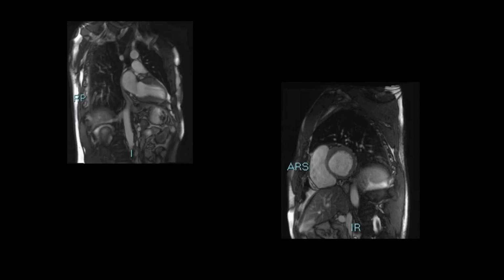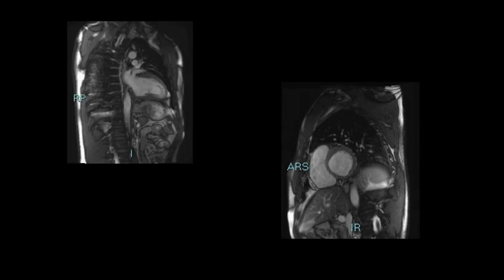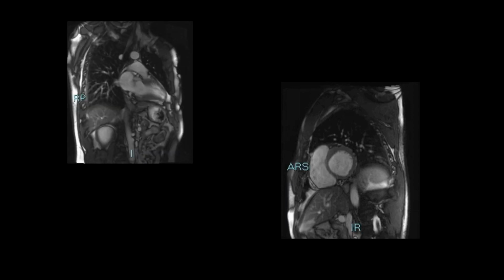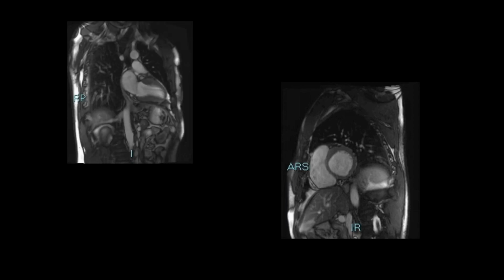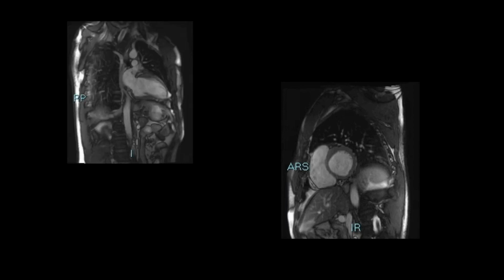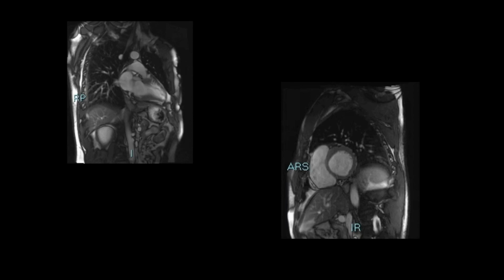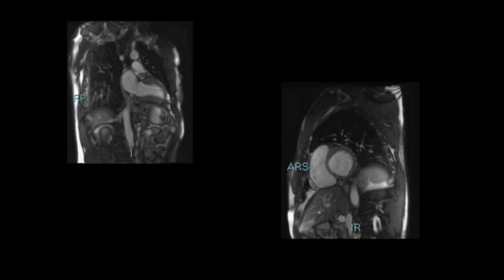In general, when we suspect a crypt, an essential issue should be defined a priori: the location of multiple crypts. Indeed, these findings are usually seen in the lateral and inferior wall, with marked trabeculation and left ventricle non-compaction. So, it is useful to differentiate from spontaneously closed ventricular septal defect.